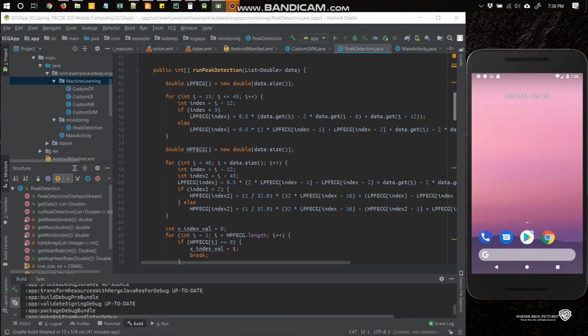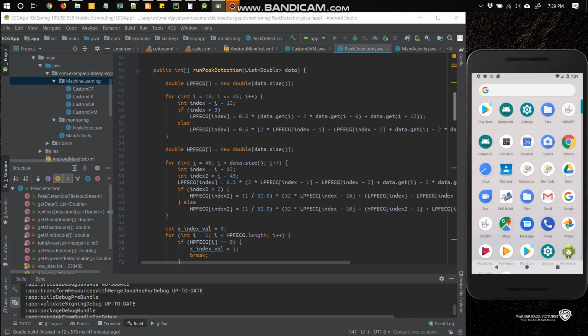This is a demo video for the final project, which we have completed more than 80% right now. So we have worked on a project called detection of bradycardia. Our app is called bradycardia app, and its basic functionality is to predict, given an ECG data file, if bradycardia is present, if bradycardia can be detected in that file or not.